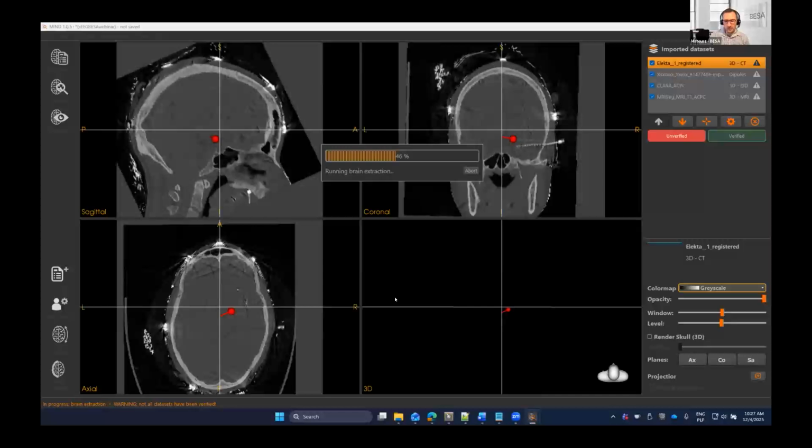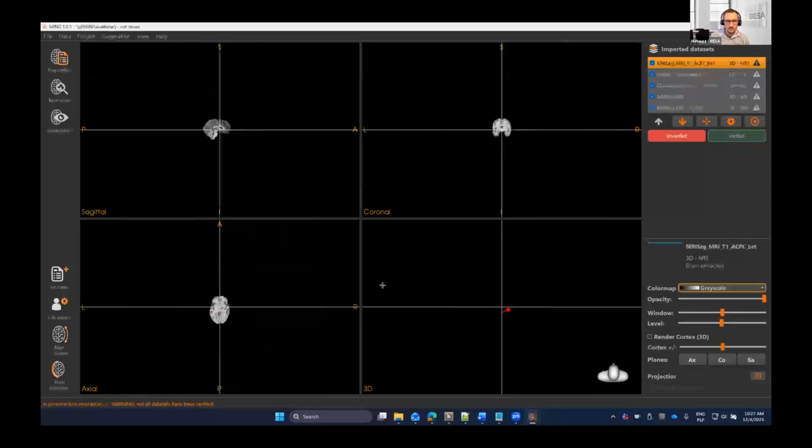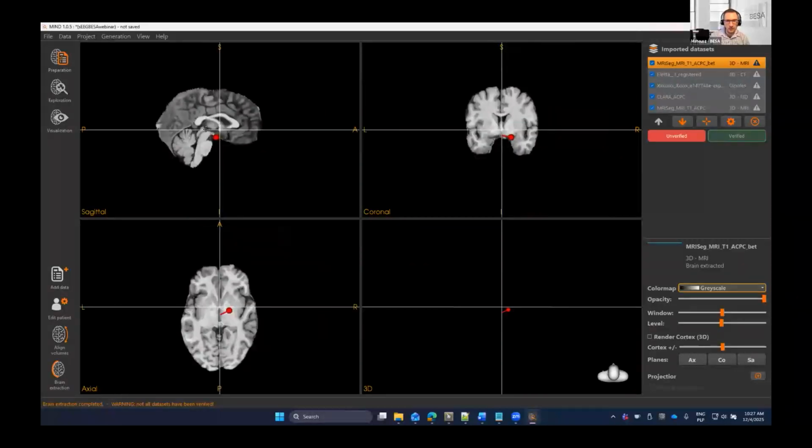It's a bit of waiting, but still better to wait than do it manually. As you see, it has nicely extracted the brain.